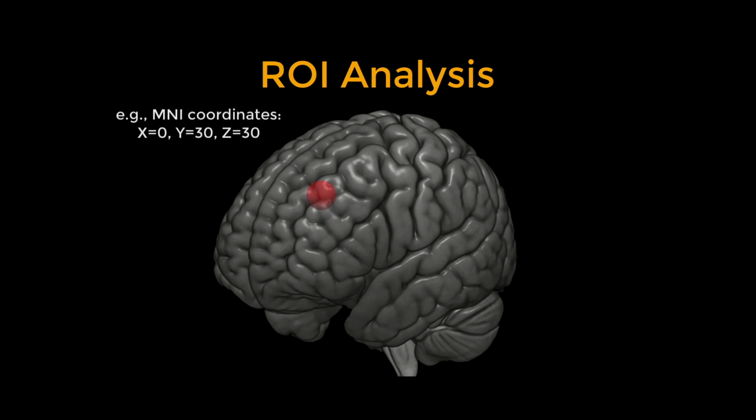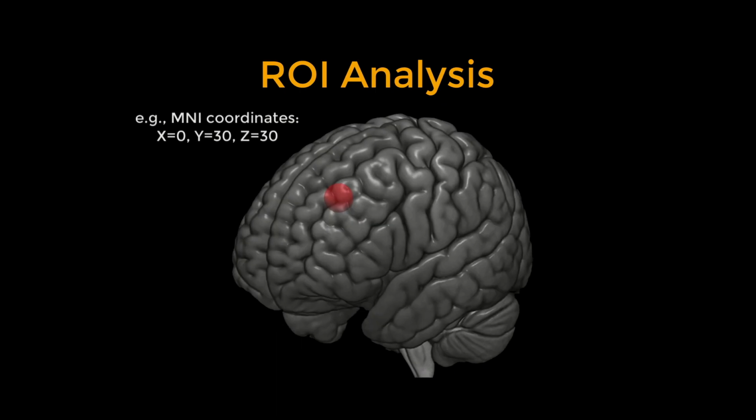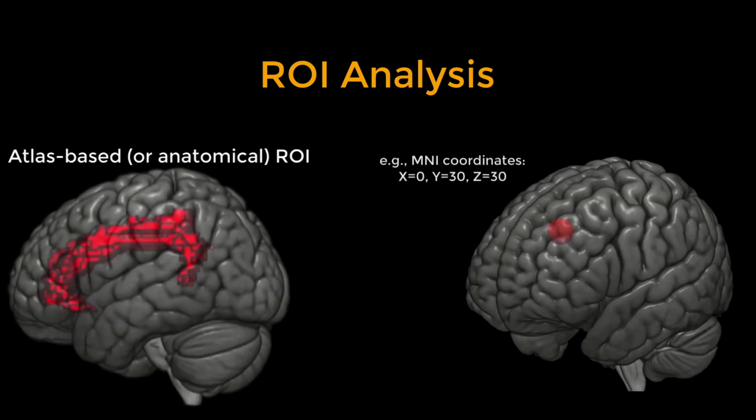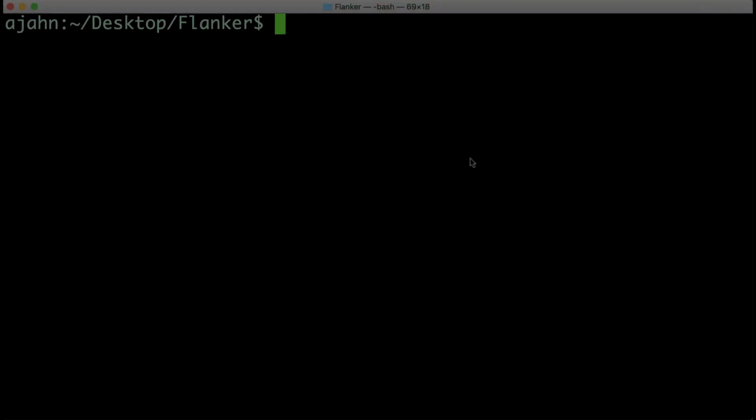These coordinates are often based on the peak activation of another study that uses the same or a similar experimental design to what you are using. In this tutorial, you will learn how to do both types of ROI analysis.